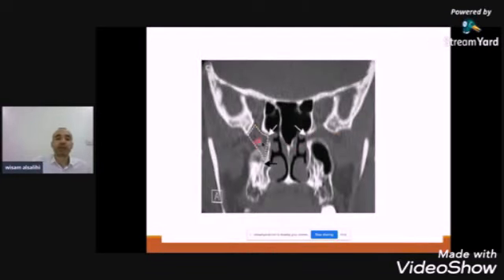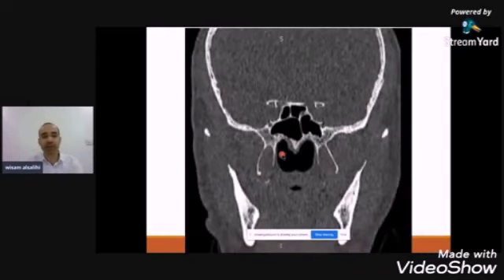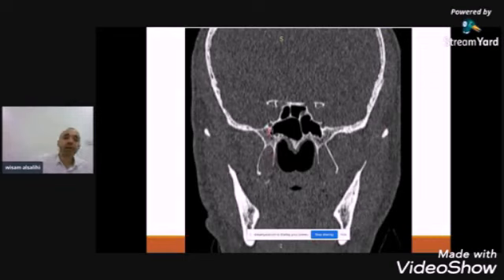This shows the pterygopalatine fossa as a six-wall cavity, and more posterior, the pterygoid plates, medial and lateral pterygoid plate, pterygoid body, and this is the sphenoid sinus. In the sphenoid sinus there are two important structures here: this is the foramen rotundum superiorly and inferiorly the Vidian canal. And in any sphenoid sinus with a horizontal septum, expect there is an onodi cell, and expect there may be a dehiscence of the optic nerve.